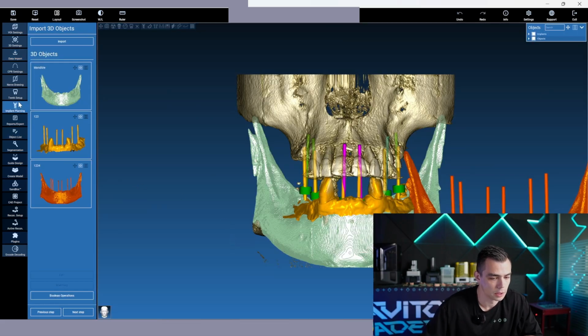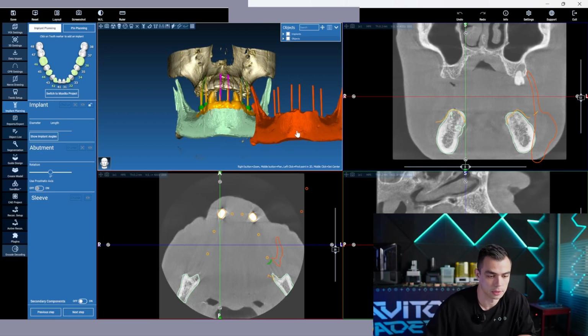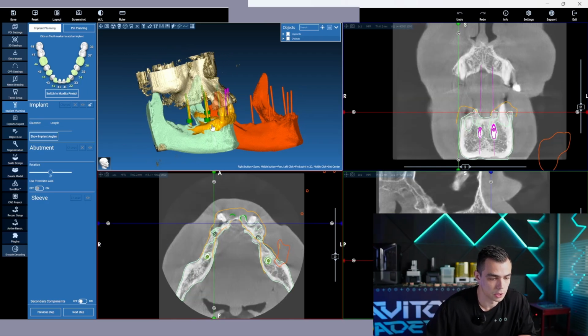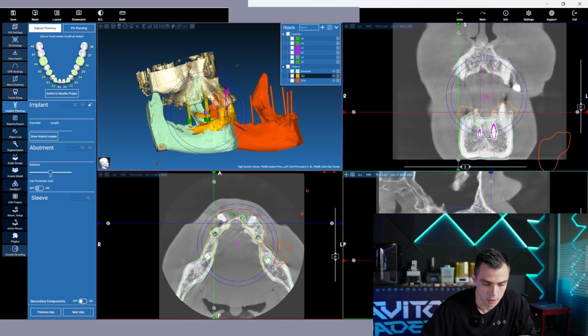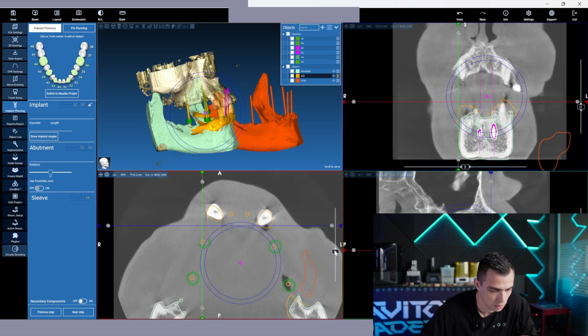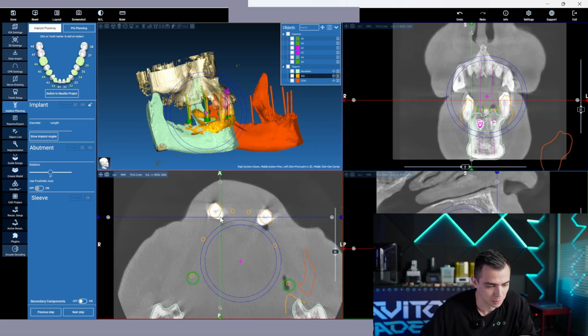But my actual goal is to show you the technique that you can not just segment the mandible or maxilla, you can just use your scans if the teeth are saved on the jaw. So now let's make it a bit more accurate, but it is impossible to do it with two existing teeth.